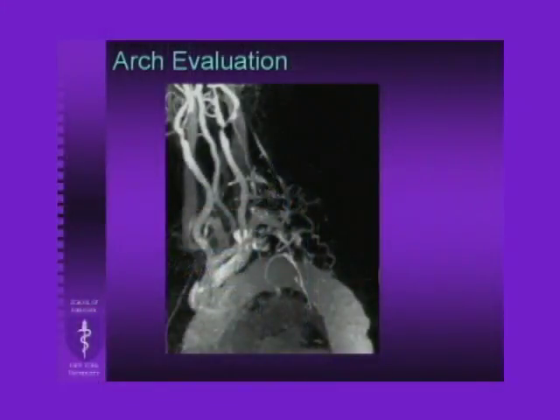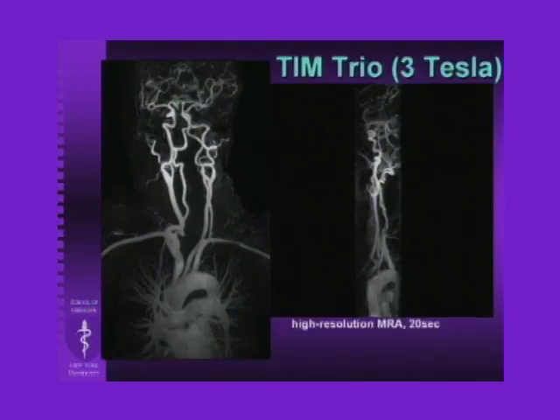One of the things I just comment on also is, and this patient has all kinds of stuff going on here. There's an AVM in the neck, but there's marked irregularity to the aortic lumen. And so this is a patient, obviously, with atherosclerosis. There's marked diffuse atherosclerosis of the lumen. Again, it's just one of those things that you ought to put in the report, if nothing else, because this patient could be having renal insufficiency, all kinds of other problems related to the more generalized atherosclerosis. So we would include that sort of as part of the dictation.